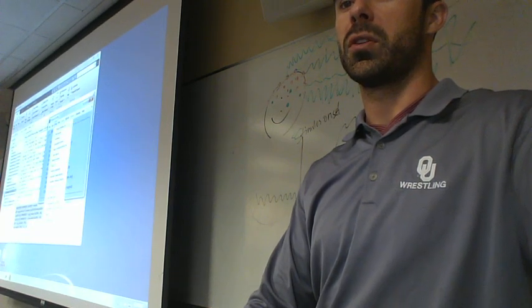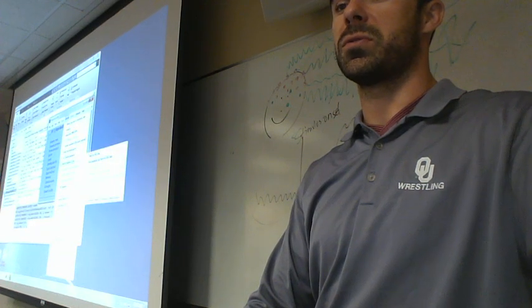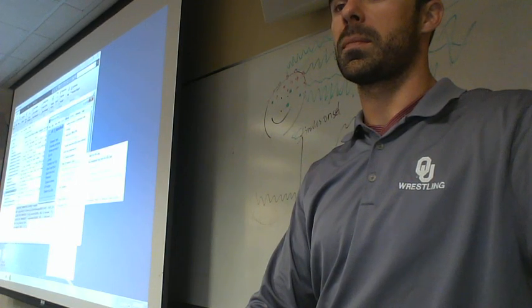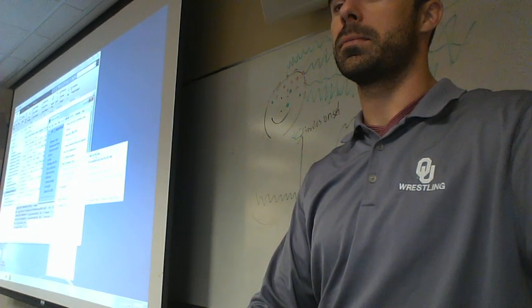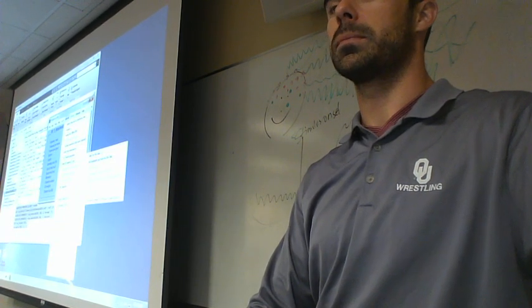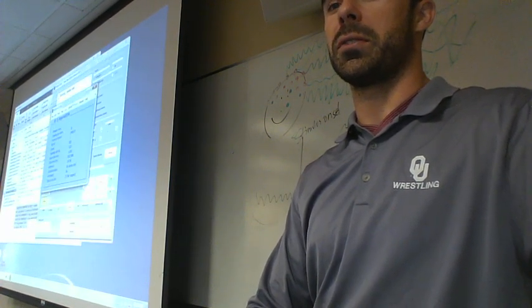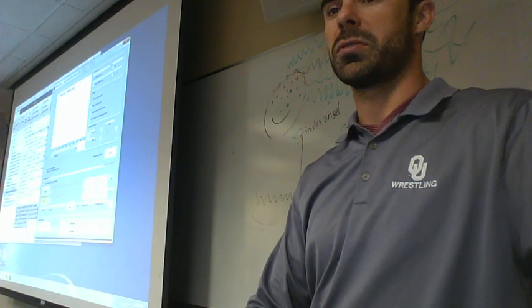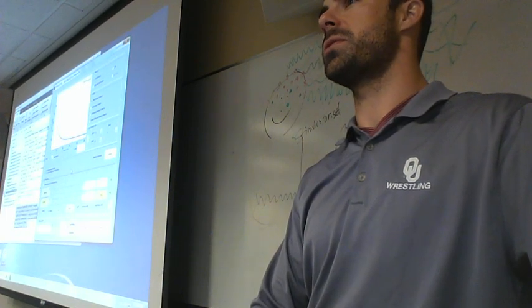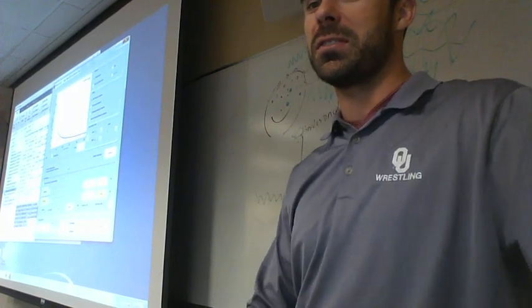Actually, what we can do, let's go to ERP Lab and let's go to filter and frequency tools. Everybody see where I'm at? We're going to go to filters for EEG. Raise your hand if you're not here. Okay. Bam. We hit that. It'll bring something up in a minute. There we go. So what does all this mean? It's a lot of stuff. You need to know about 1% of it, and the 1% you need to know is down here.